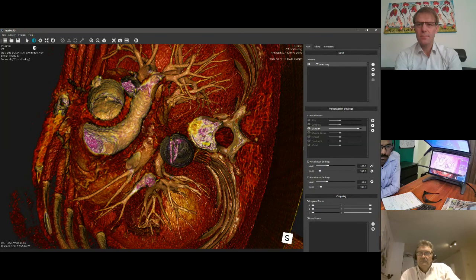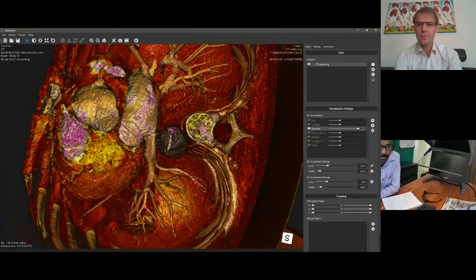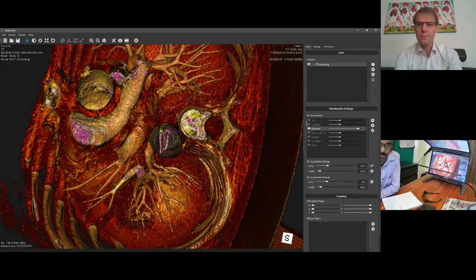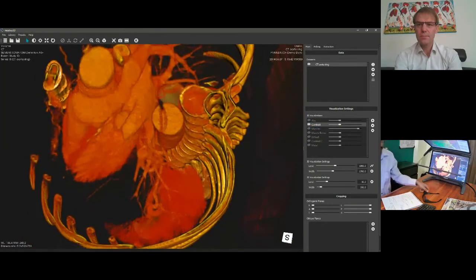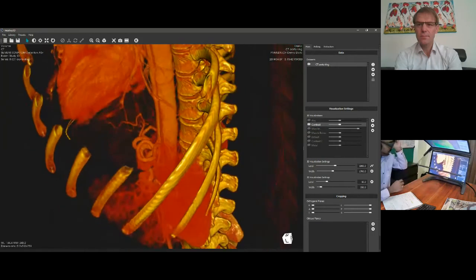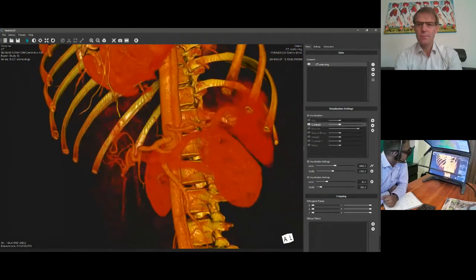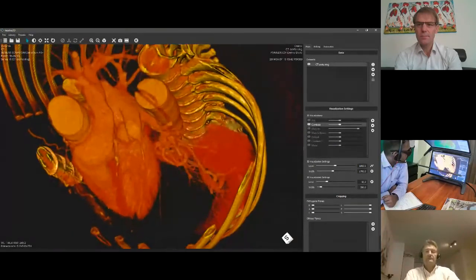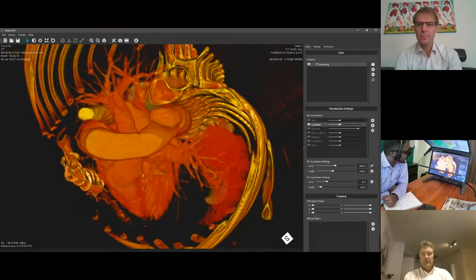These are all tools that are standard available in Visualisation, and all I'm doing is just fiddling around and flying through the data. And because we have the ability to immediately go in between data sets and visualizations, if I don't understand where I am, I can readjust it and immediately get back to a nice understanding of the data. Mark, can you hear me?